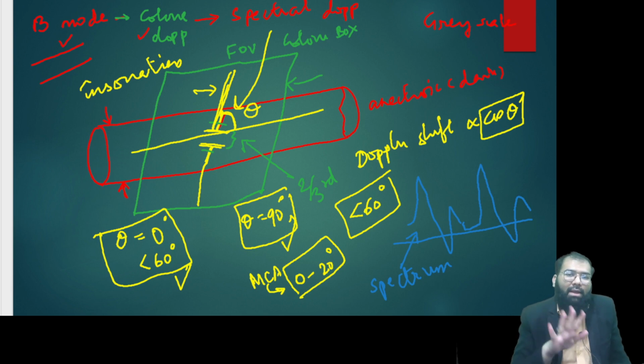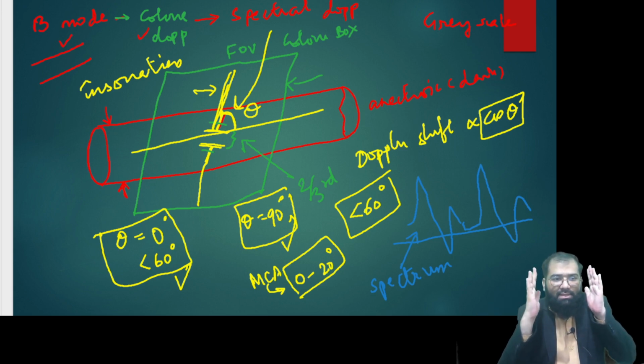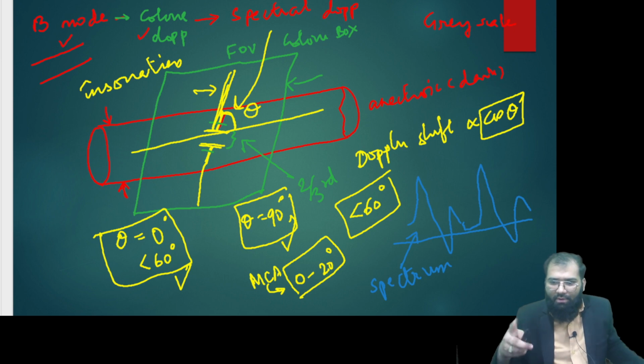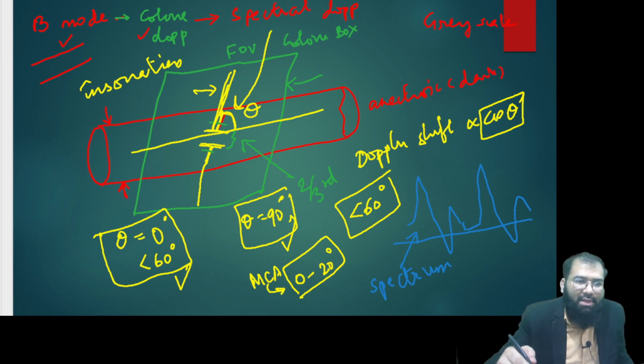And when you just see it routinely, that becomes your B mode imaging. I hope that this clears the fundamentals. Now we'll apply whatever we have learned here. So let us apply this to a beautiful example.